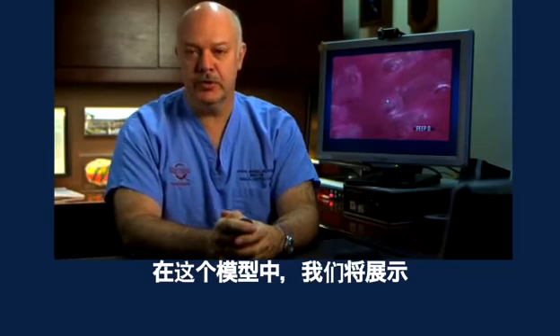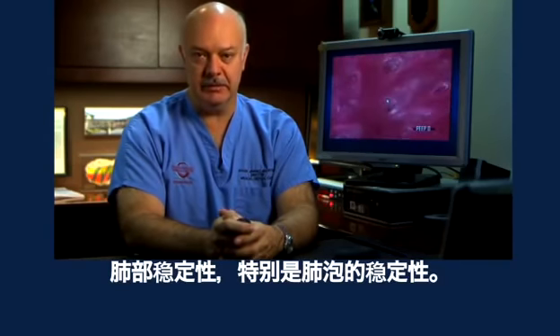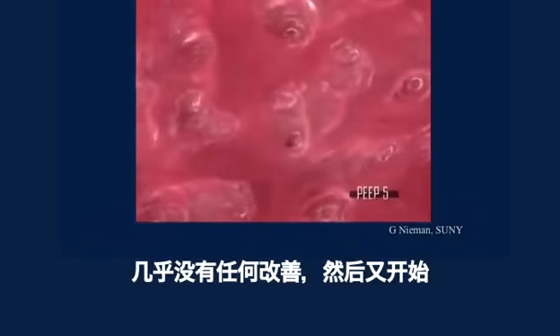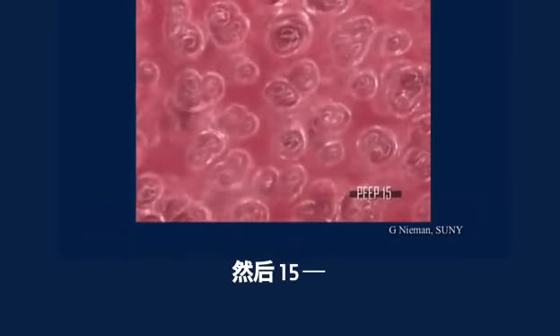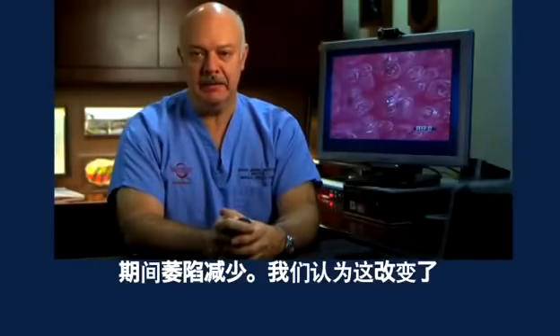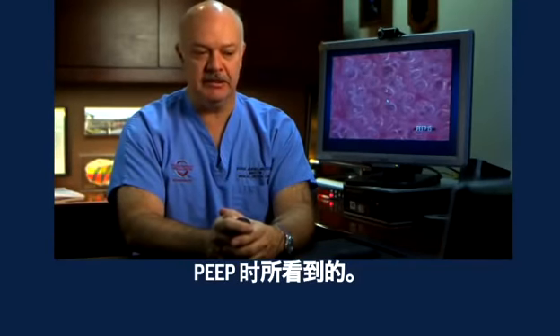In this model, we're going to show you how the progressive application of PEEP shows further lung stability, particularly alveolar stability. You see here with a PEEP of 0 how the alveoli are very unstable, opening and closing at each moment of expiration. With a PEEP of 5, there's barely an improvement for a few cycles and then it starts dropping again. As we progressively increase the PEEP to 10, to 15, and to 20, we see progressive alveolar recruitment and stabilization with less collapse during the expiratory phase. We believe this changes the pattern of atelectrauma that we may be seeing with the use of very low PEEP in some of our patients.